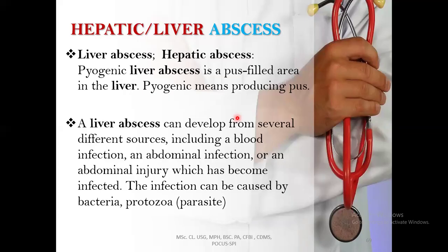Take note. Once you see ascites, know that the liver is decompensated, meaning the liver has lost its synthetic function, or it has reduced drastically. So ascites is the first sign that the person is in decompensated cirrhosis.